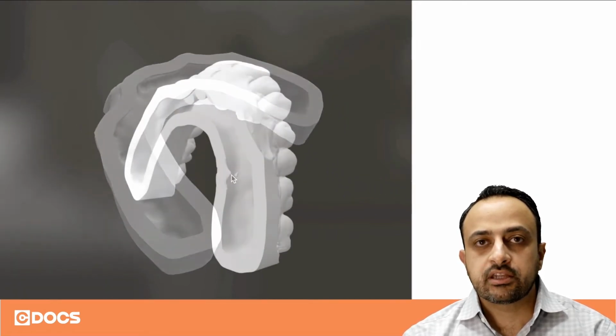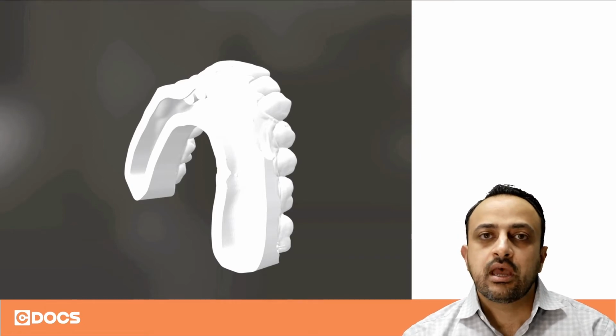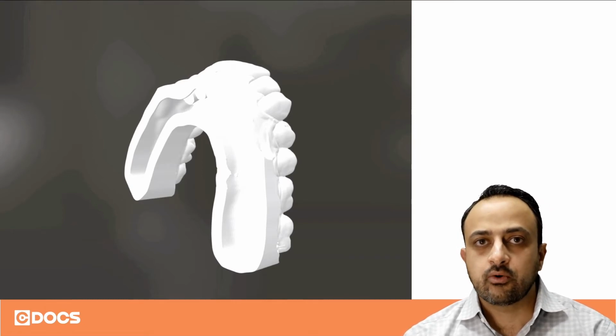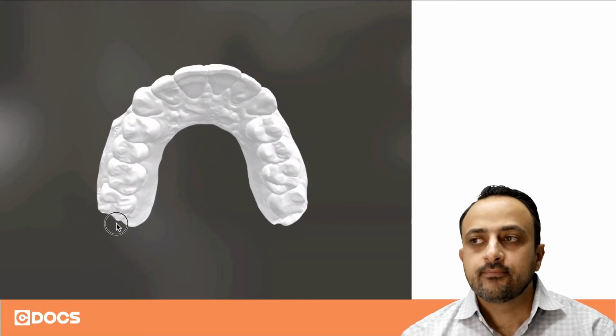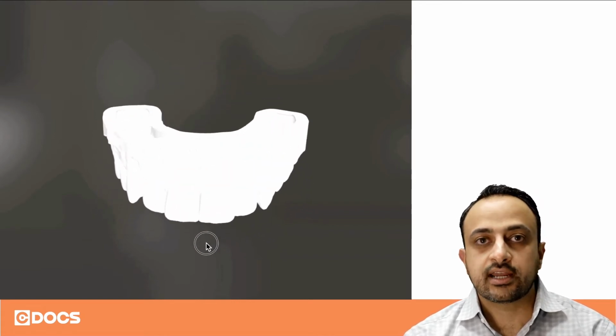One of the things I like to do is order a diagnostic wax up from my lab technician. You can see on the screen here, this is the STL of the wax up. So the challenge I have right now is, how do I know where to prep? Obviously, some of the teeth are going to be additive, some of them are going to be subtractive. How do I know where to go and how to prepare the teeth?